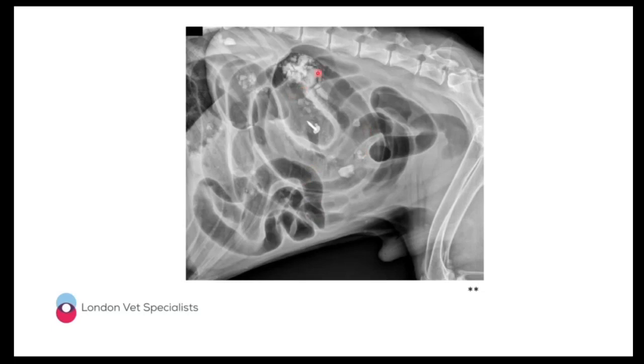It does look as if they're kind of stacked up, but all of the bowel is present in the mid-abdomen. And this is an example of a mesenteric volvulus. So this dog didn't have a foreign body, didn't have a mechanical ileus, it had a mesenteric volvulus, so the intestine was twisted at the root of the mesentery, resulting in ischemia and then gross dilation of all of the loops of the small bowel. So this is what a mesenteric volvulus looks like.